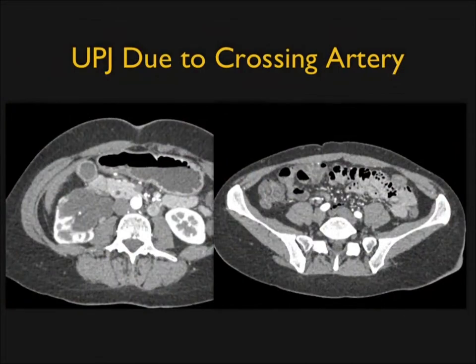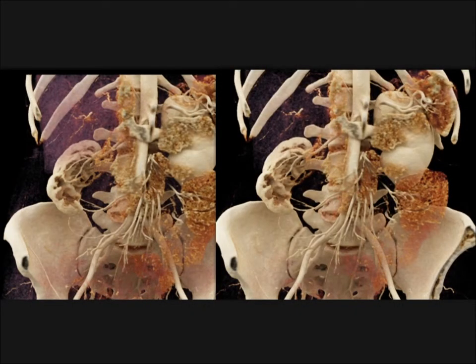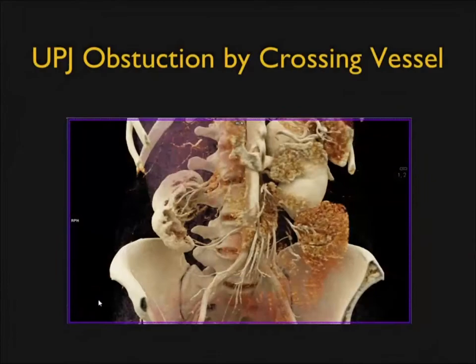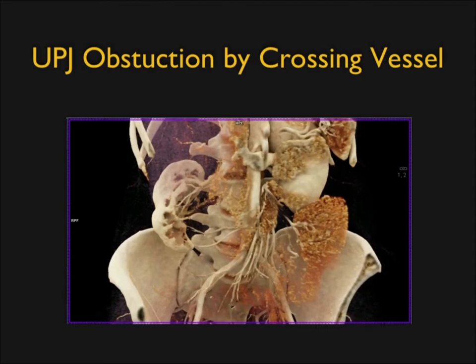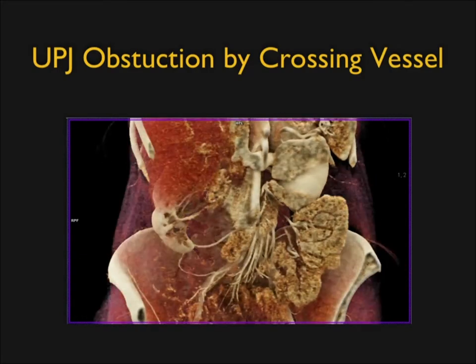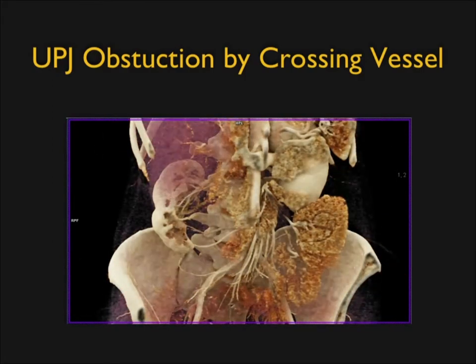We talk about problem solving, dilated renal pelvis, UPJ versus tumor. Well, here it is on a 3D. You see two right renal arteries, and the lower renal artery crosses the renal pelvis, a classic UPJ obstruction. Just a beautiful example of that. And finally, in this example, we're going to look at the patient's kidneys. And what you see is, look at the patient's right renal pelvis. It's dilated. You see the two vessels. That's the example we showed you a moment ago. That's the classic UPJ.